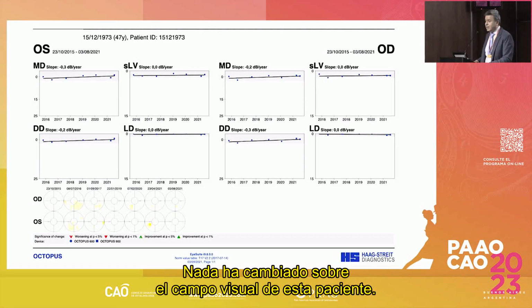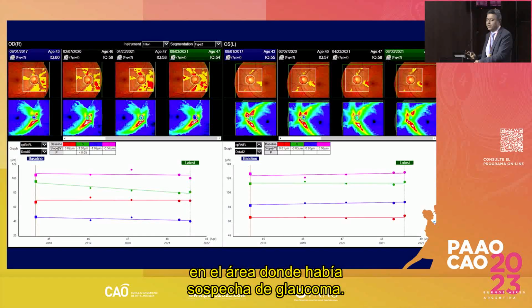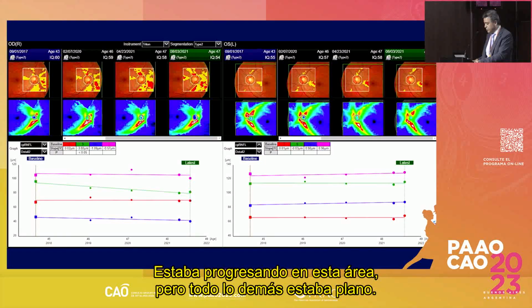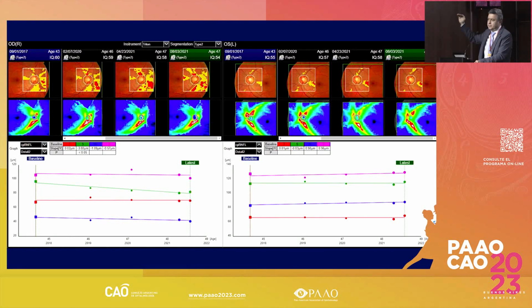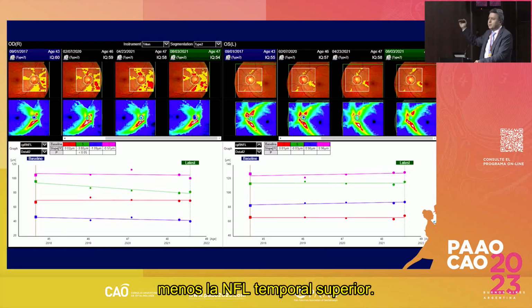And nothing had changed in the visual field for this patient. But look at the progression analysis in the area where there was a glaucoma suspect. It was progressing in this area and everything else was flat. This is interesting: everything else was flat, except the superior temporal nerve fiber layer.